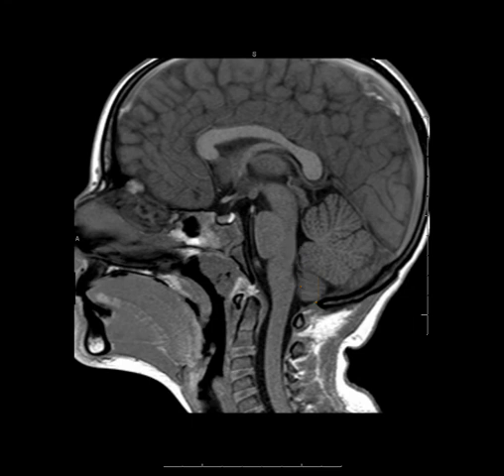The posterior portion of the sphenoid bone is called the clivus, which is Latin for slope. And also evident on this patient's image, an 11-year-old kid, is the sphenooccipital synchondrosis. This kid also doesn't have much of a sphenoid sinus at this point. You can see a little rudimentary sinus, but in many patients the sphenoid sinus will extend all the way posteriorly underneath the sella turcica, which is here outlined in arrows.